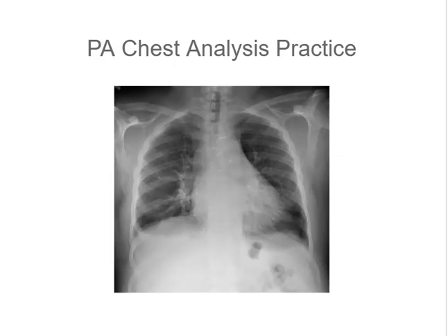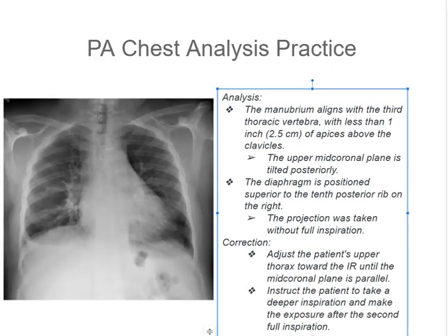Now we'll take a second for you to evaluate this image and answer the following question. Let's do this practice analysis together.